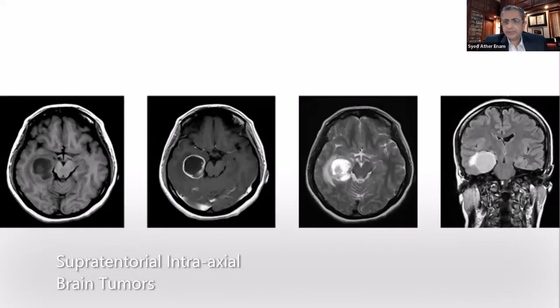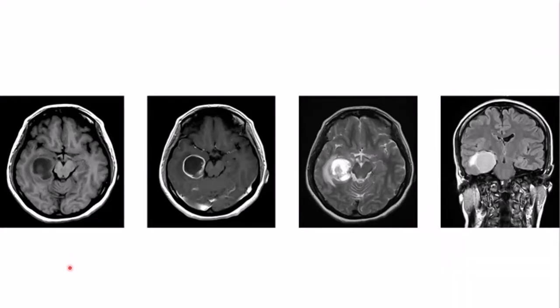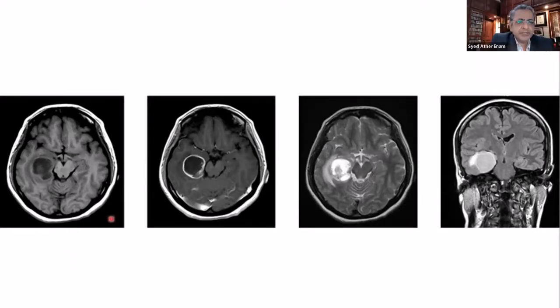Hit the ground running. So when I see an MRI, these are the first few things that you want to observe. So this is a 24-year-old right-handed female who presented with generalized tonic-clonic seizures, as far as I remember. On MRI, there was this lesion.